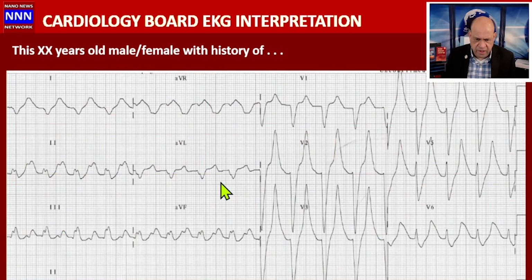And here we have an electrocardiogram which looks pretty sick. Whenever you see an electrocardiogram that is pretty sick, you should always think about what the underlying condition is. I can say this is like a 55-year-old hypertensive patient on dialysis who missed 2 dialyses. That should be a tip-off. This is a patient with hyperacute T waves suggestive of hyperkalemia.